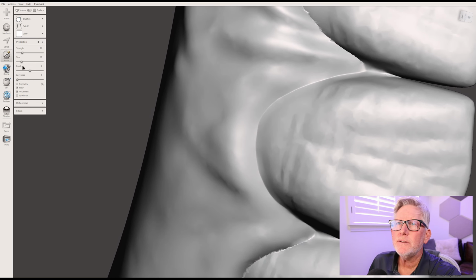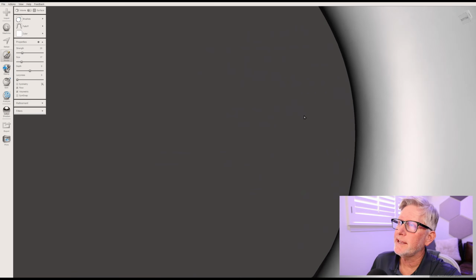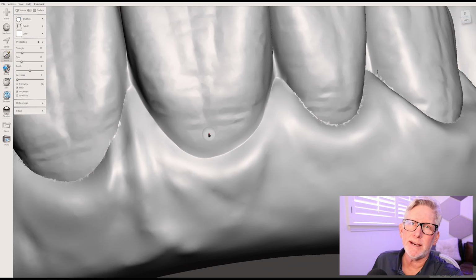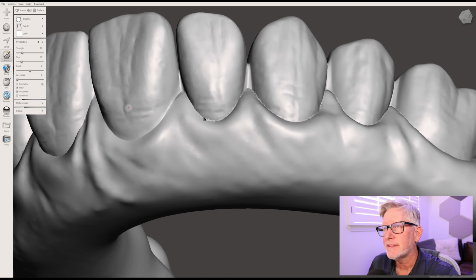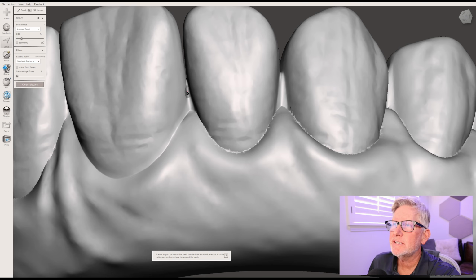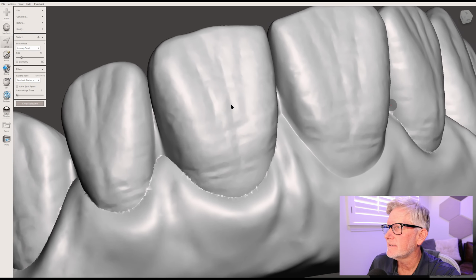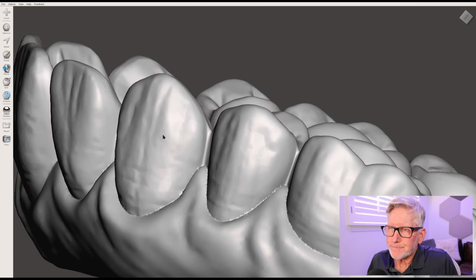Can you imagine if you put the size up and radiused it perfect to your smallest burr that you're going to get to? Well, you'd be able to make this pattern perfectly replicated in the CAM if you're utilizing those techniques. Can you imagine what you could do in joints like this? And it's just an amazing tool to be able to come back and clean things. And get off of that real quick.